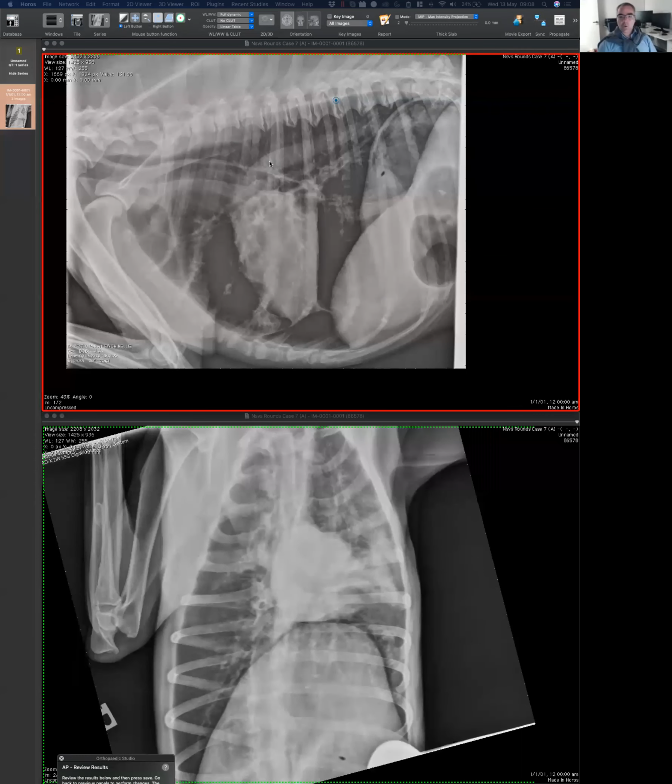So what do you think about this case? These are the 2 radiographs that were taken originally. If anybody's got background noise and can't turn their mic on, just send your interpretations or comments through the chat channel and I'll relay them to Mariano. Yeah, that's a good idea.